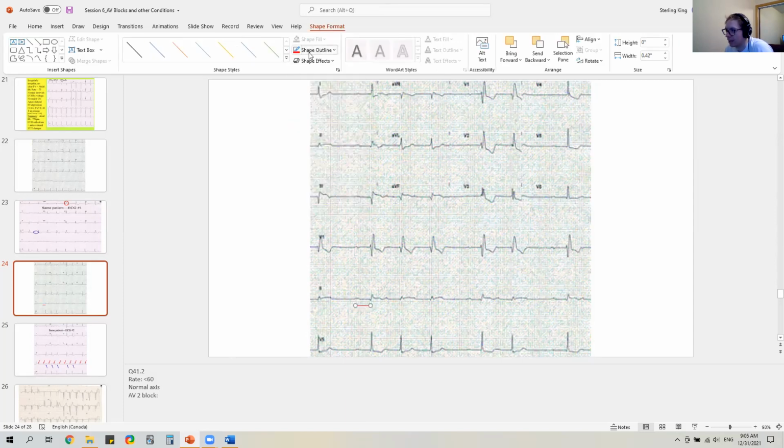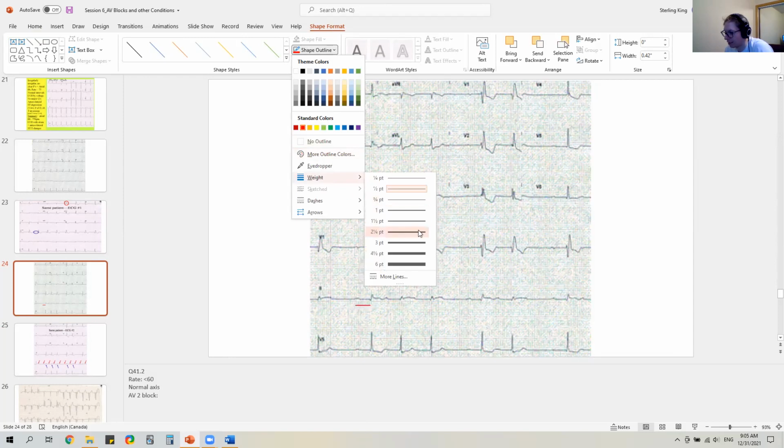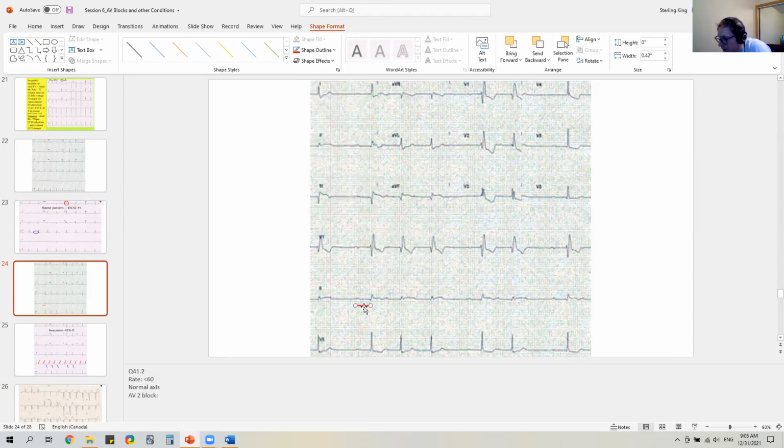So that way I can compare it, because this graph is not very high quality. If I look at this, this is that line. If I compare it to here, it looks about the same as the next one. It definitely got longer there. If that's the P wave just on the left side of that bar, and that's the QRS, it's now wider than the line. So let's try it again over here, because this is the P with the dropped QRS. So yeah, it's within that line.